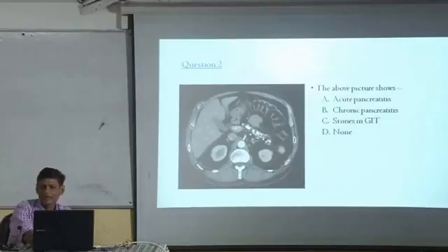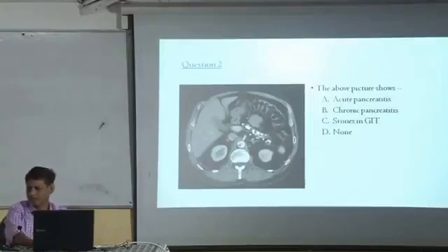And can you recognize the other structures here? This is the liver. Somewhere here is the spleen. These are all the parts of the intestine. These are the kidneys. And this structure that is kept over here is the abdominal aorta, just in front of the vertebrae, a little bit towards the left side.